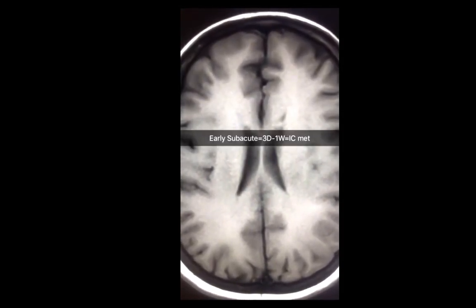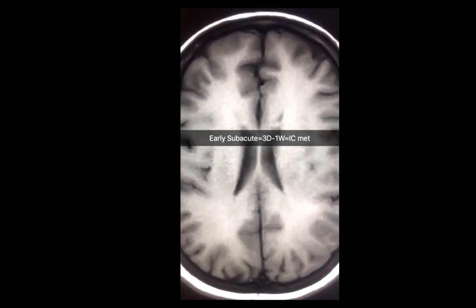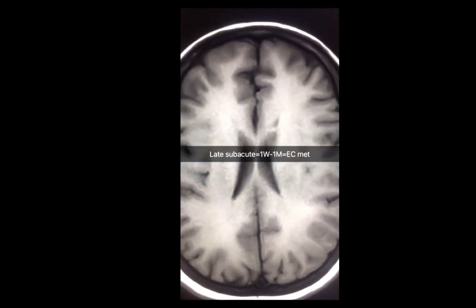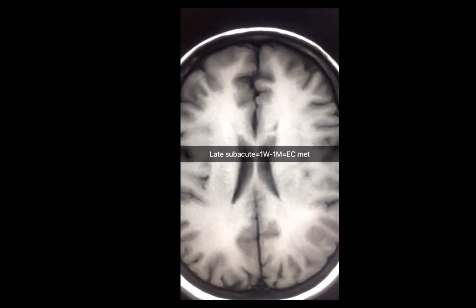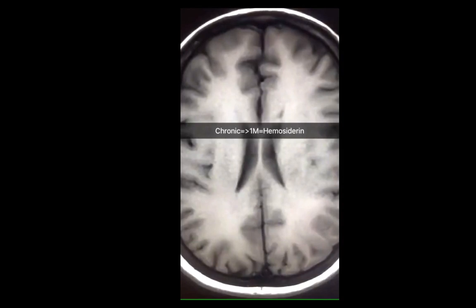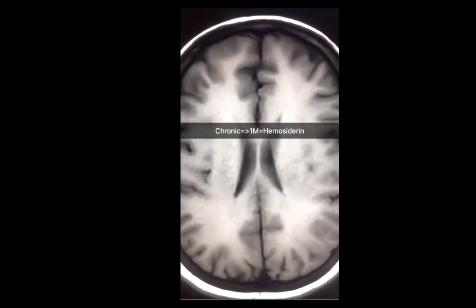Early subacute blood occurs between 3 days and 1 week and is composed of intracellular methemoglobin. Late subacute blood is mainly composed of extracellular methemoglobin and occurs about 1 week to 1 month later. Chronic bleeding more than a month degrades into hemosiderin.